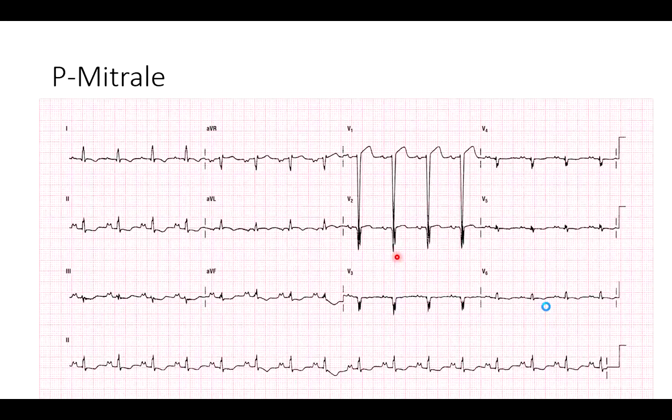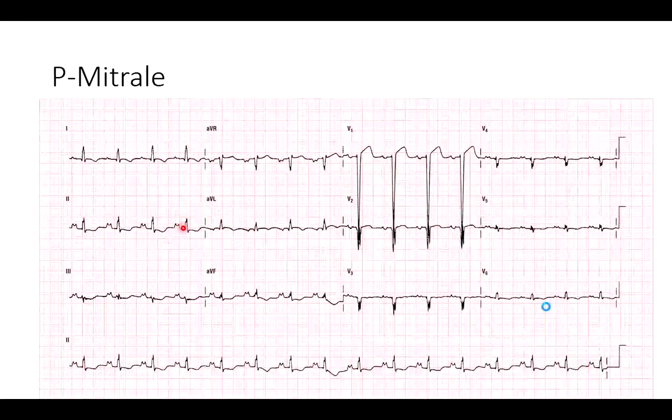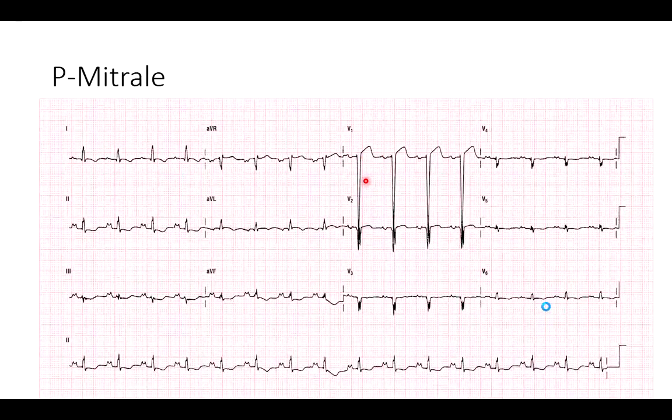Folks, we're looking at somebody with left ventricular hypertrophy who also has left atrial enlargement. Do you see this? I see one thing and I go, oh, let me see if this is present. Oh, there it is. I look over here. Oh, look at this. There's a biphasic P wave. This might also confirm for me, and we'll be able to talk about some of the criteria. But this biphasic P wave here, I look over here. I have some indicators that now I'm starting to see two or three things similar.